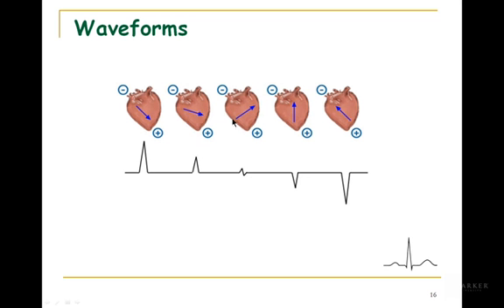This one is pretty much perpendicular, so this one is biphasic or equiphasic, or we could have had a baseline recording. These two are negative, downwards deflected waveforms because the vector is running towards the negative recording electrode, and the one that gives you the most recorded voltage would be the one again that's running parallel to the particular lead axis.